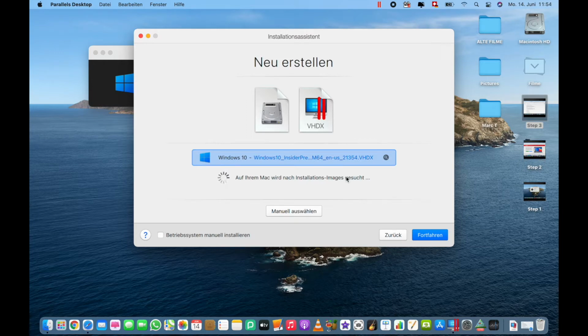So all we need to do is basically install Windows 10 just as we would install Windows 10 on a standard machine. And this also takes a little less time than it normally does for another Windows version. And once we've finished, I will show you the next steps.